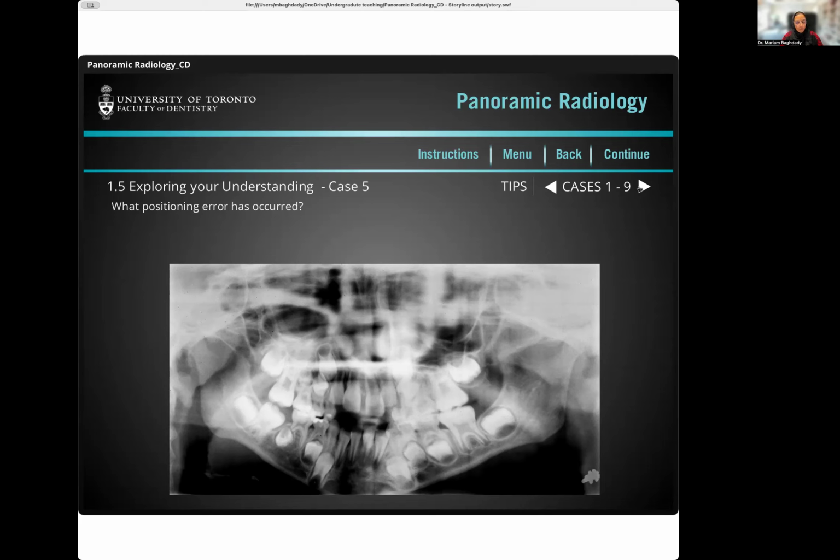Fatma, can you tell me, what do you see here? What is the visual thing that you can see here? Okay, the teeth on the right look smaller than the teeth on the left. Right. And the mandible? The ramus on the left is huge. The ramus on the right is smaller. Right. Beautiful. Thank you very much, Fatma.